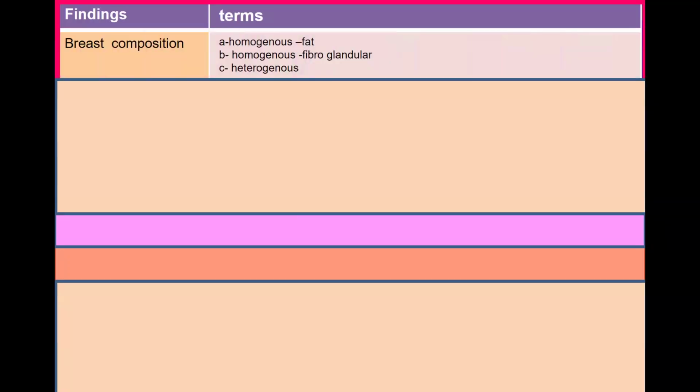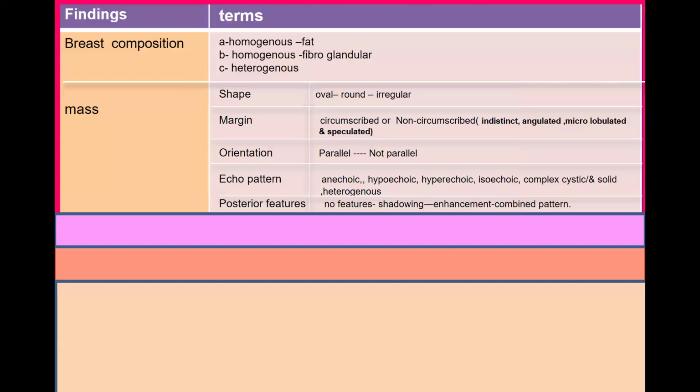As you know, the lexicon starts with breast composition, which we have already discussed before, and then describes the mass.